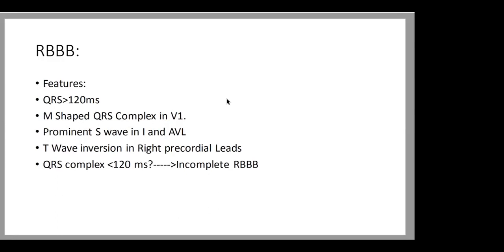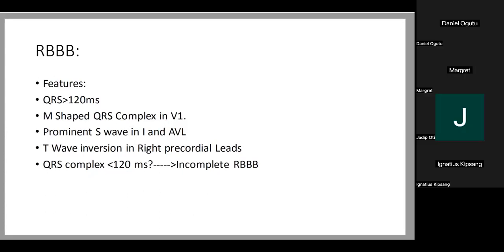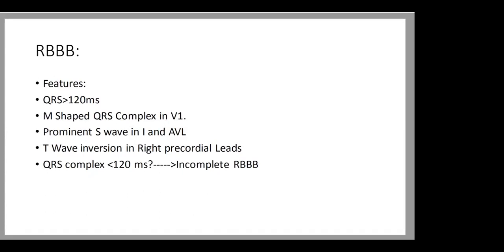When we talk about a T wave inversion, you have to correlate it to the QRS complex. If you have a QRS complex that faces up, where the deflection is positive, and the T wave that comes after it has a negative deflection, then we have an inversion, and it's pathological. So you just have to be very careful when you see a negative T wave. You have to go back and look at the QRS complex to find out if it's facing the same direction or the other direction. Otherwise, we don't have an inversion if they face the same direction.